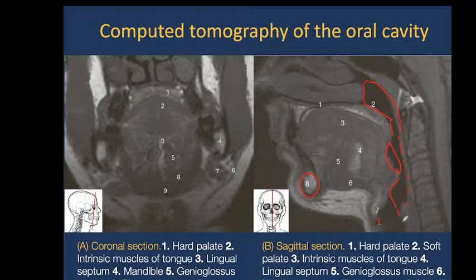And also very good to see the air inside of larynx, because that is the organ which contains the air inside.